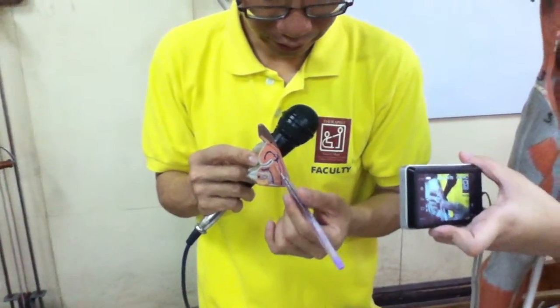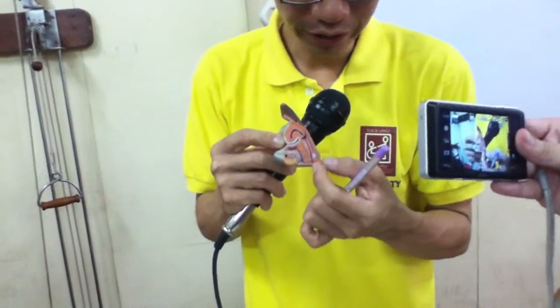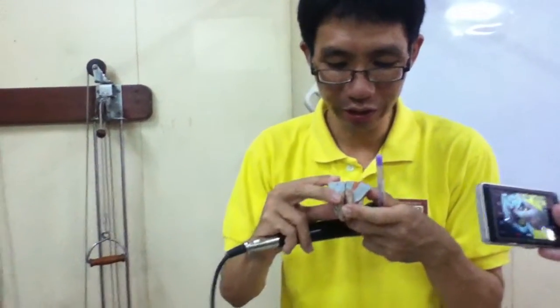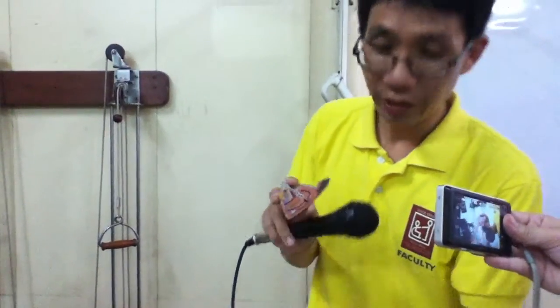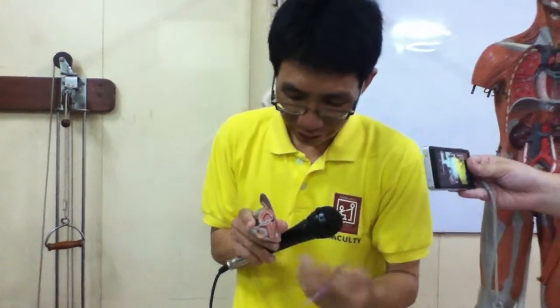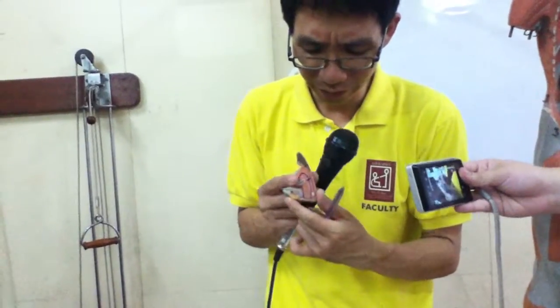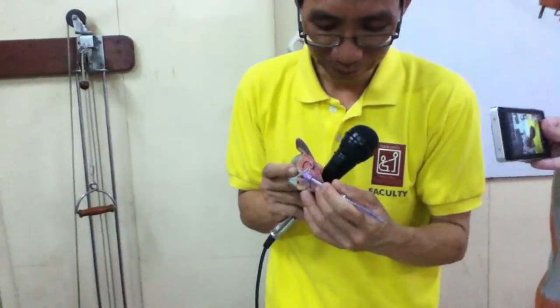Then further down, in this position, you now have the vagina. Expect that this is the vagina. Here. So, you have your vagina. Okay. So, this red, as we mentioned, you have your urinary bladder. So, I will mark it also. This one would be your urinary bladder. Take note, get your ballpen. Blue, your urinary bladder.